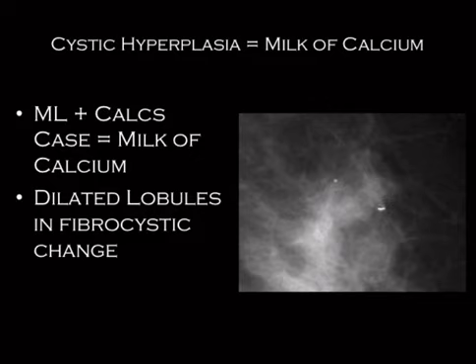That does not require a stereotactic biopsy. But you can always biopsy at the patient's request, because what's one more false positive biopsy result, right? Or false negative, whatever. What's one more unnecessary biopsy? This is mammography. Unnecessary biopsies are what we do.